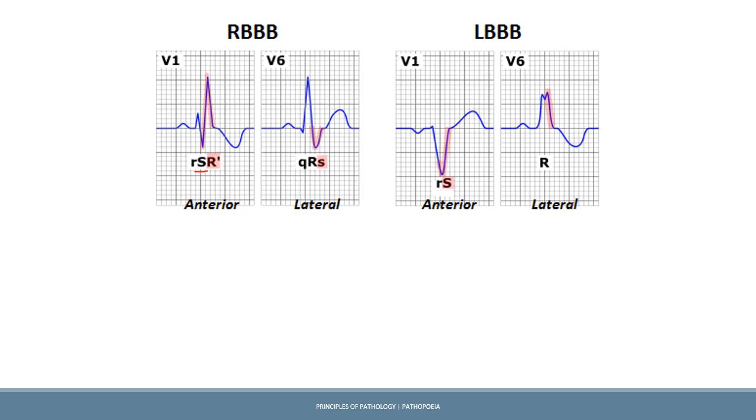And hence we know that there is a positive deviation in the lead V1 because of the first vector which we plotted, and that is towards V1, right? And therefore we see an R wave because it is a positive deviation. Now again, what do we see? There is a negative deviation.